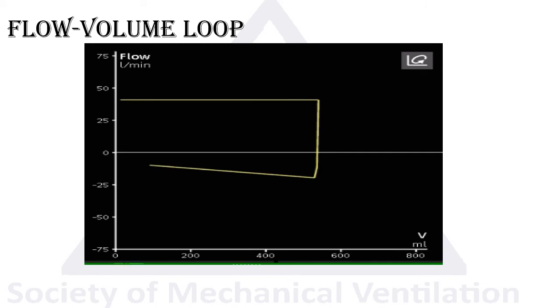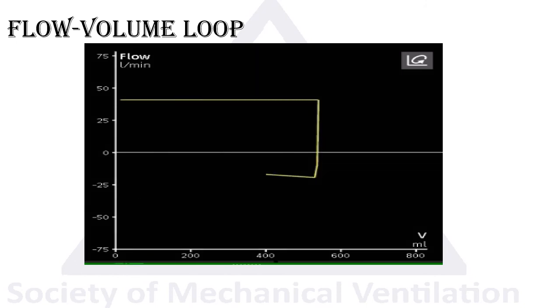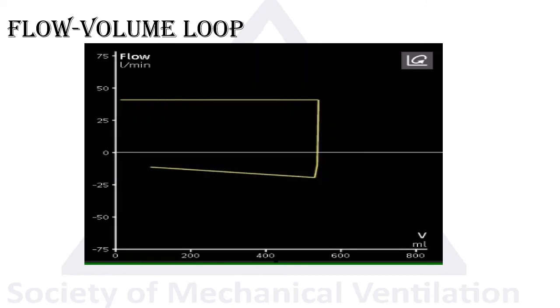All right, we'll pause it to show the effect of, sorry, it's not letting me catch the auto-PEEP, but you can tell here that the expiratory flow does not reach the baseline before the next breath, so that's another way of detecting auto-PEEP.